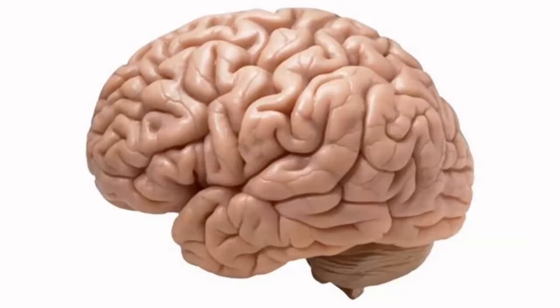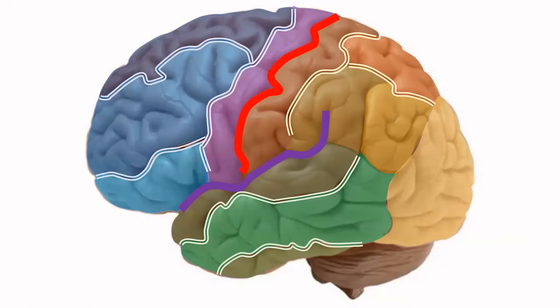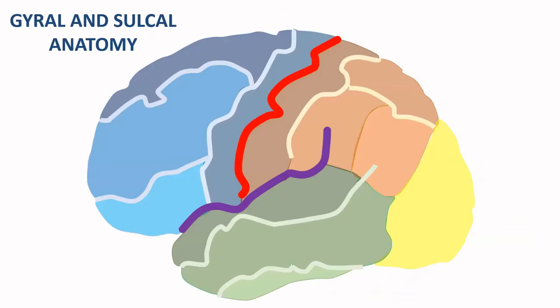So now we have a very broad functional division of the brain based on the division in lobes, but that's, as said, still very, very broad. So the brain contains a lot of gyri and sulci, and on this image, I actually marked those for you. And we are now going to discuss the most important gyri and sulci on the lateral brain surface. I've made a scheme or a drawing for you because that makes it a lot easier.